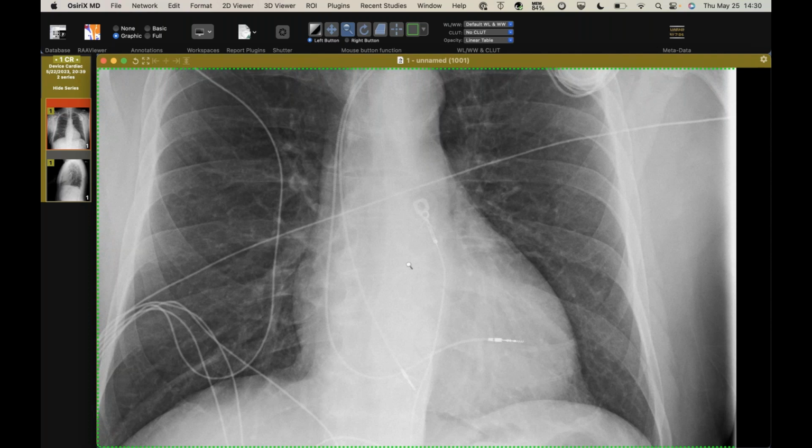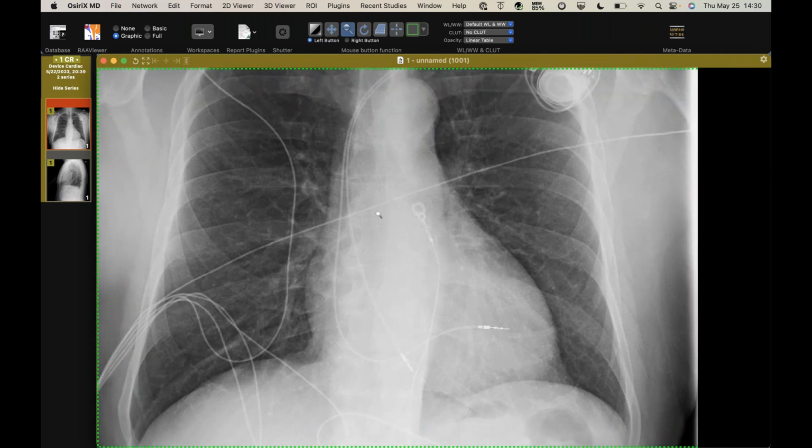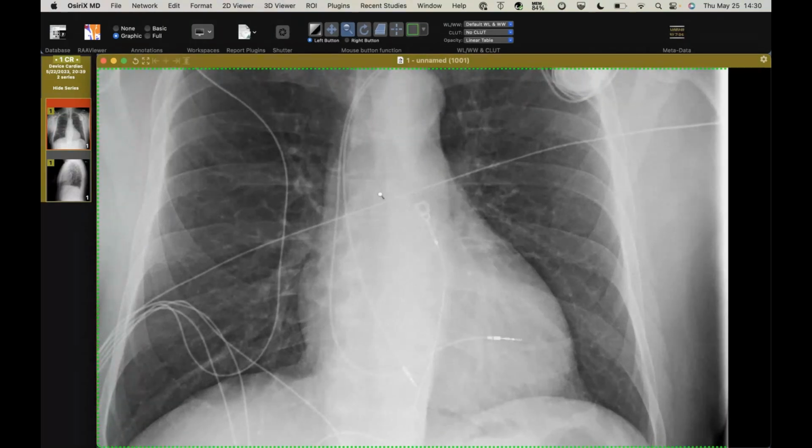So this had come out right after the procedure. I mean, the patient, after coming out of the PACU, the first thing they do is they send them for a 2-view radiograph once their sedation is worn off, or if they use whatever anesthesia. So this is usually within hours, if not just a couple of hours of the procedure. So this was an immediate post-procedural complication, and they're not always aware of this because they test everything in the cath lab before they leave, and everything's working fine.